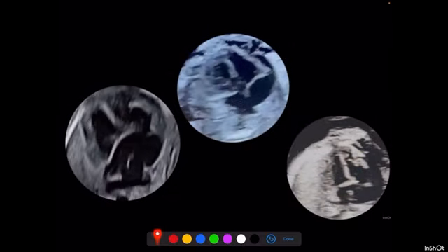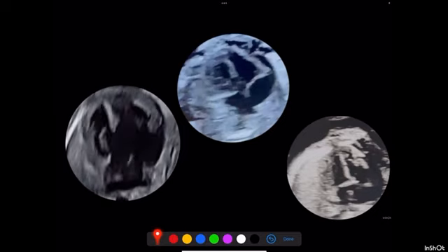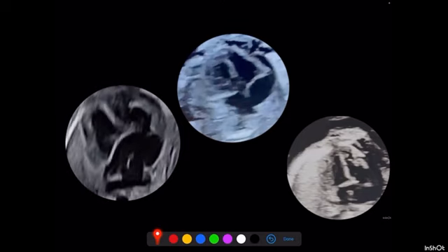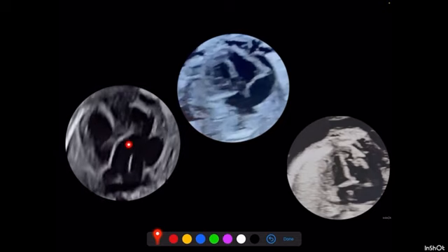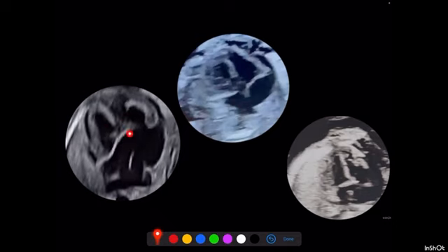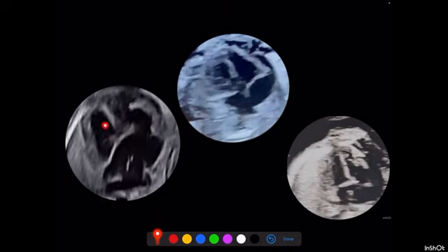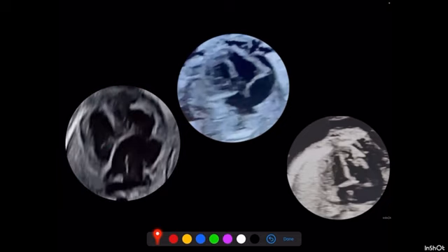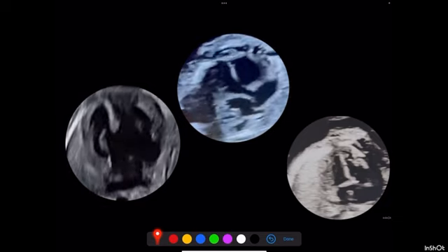If you look at the first video, you can clearly see that there is an increase in the atrial length. Just by eyeballing, you can understand that. Now, this is the opening and closure of the common valve. You can see there is only one inlet, and it is equally opening into both ventricles. The size of both ventricles is almost the same, and the opening is equally distributed. Now let's come to the second picture.